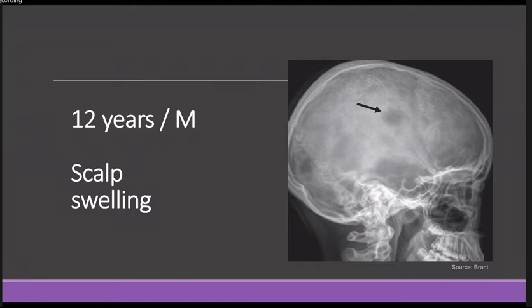see eosinophilic granuloma appearing as a lucent lesion with a characteristic beveled edge or the hole-in-hole appearance. This is because of the unequal involvement of the inner and outer tables of the calvarium. If there are multiple skull lesions, they can coalesce, and this would give a geographic appearance.